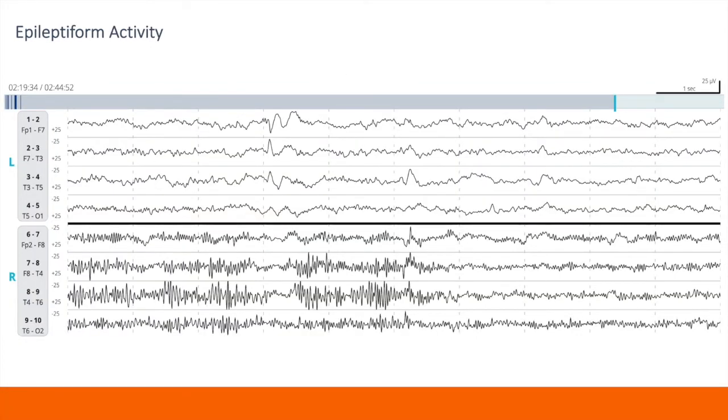Now we are entering the orange territory. It is because in this case you have one epileptiform spike that is characterized by a sharp departure from the baseline. Usually it has 3 phases. It has an up, down, and up type of pattern, and also what we call phase reversal. The phase of this waveform and the phase of this waveform are being reversed right here.